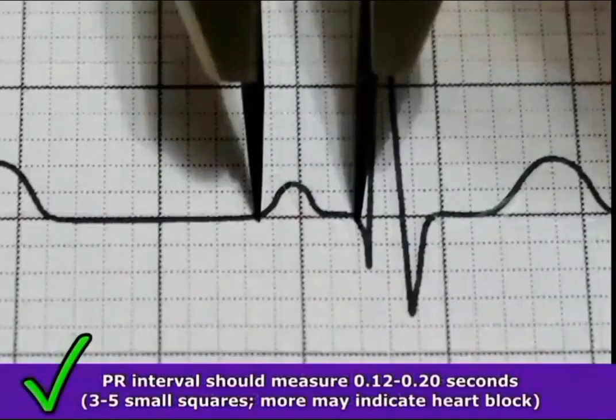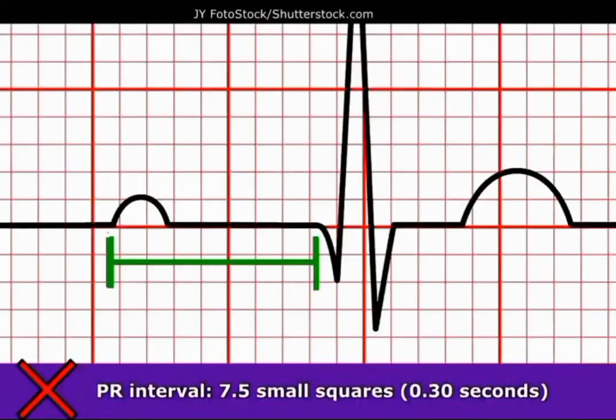Next, look at the PR interval. The PR interval, again, starts at the beginning of the P wave and extends to the beginning of the QRS complex. And you're looking at its measurement. It should be about 0.12 to 0.20 seconds, so about 3 to 5 boxes. Any more than that, you may be thinking heart block. Here we have a picture of a first-degree heart block, and notice that that PR interval is more than 0.20.